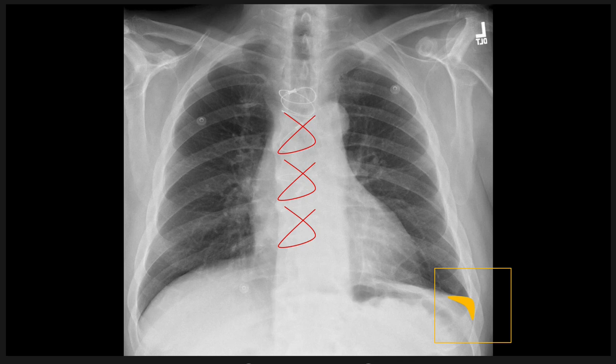I feel like almost every case of post-cabbage that I've read, followed up, has had a little bit of pleural thickening or scarring at that. It's almost always on the left costophrenic angle. So you'll see this a lot. That's what it looks like, and that's the reason it's there. And like I said, you could prove it by seeing that it's persistent on multiple priors. If you really needed to, you could put them in the decubitus view.